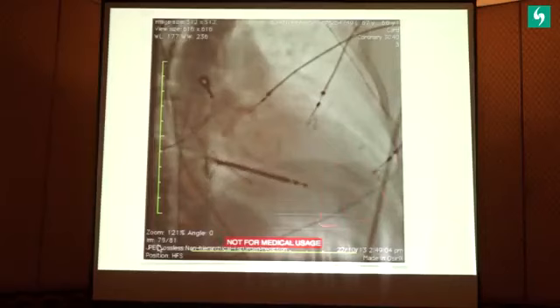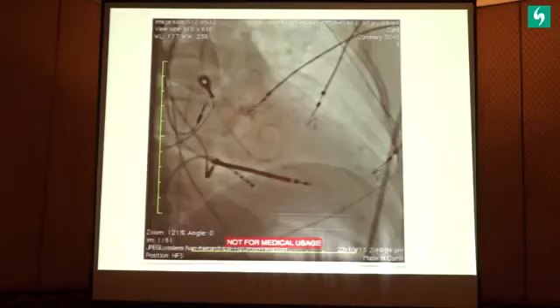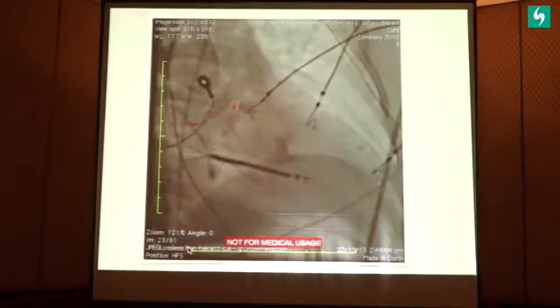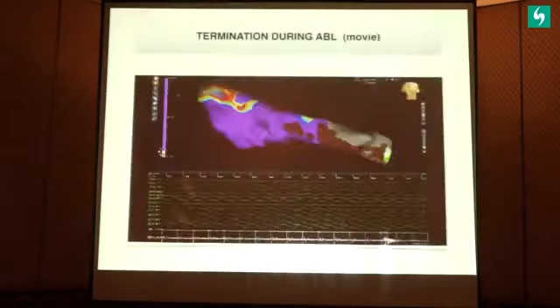So this was mapped further, and you see this is the ICD lead. These are the multiple leads, and this is an LV angiogram of the same patient. You would see this apex. It's bulging, not contracting at all. And look at this part, which is this part of the left ventricle is hypertrophied and hypercontractile.